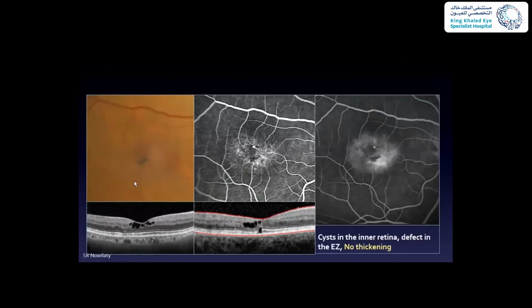Now, here you have a patient that has juxtafoveal telangiectasia, MACTEL, macular telangiectasia type 2. In this case, commonly you have capillaries that stain on fluorescein, and you have loss of Müller cells, and then often you have crystals in the retina, and sometimes in stage 4 you have pigment deposition. So here it is. You don't see much. There's a grayish look of the fovea. If you do a fluorescein, this is early on and this is late. You see a little bit of staining, and this is where the pigment is. And that's how it is.